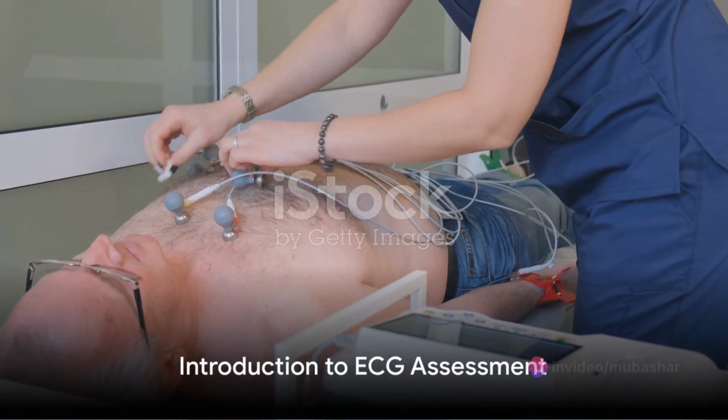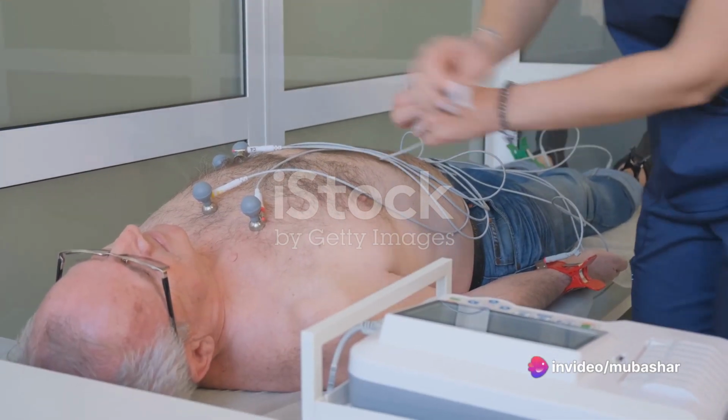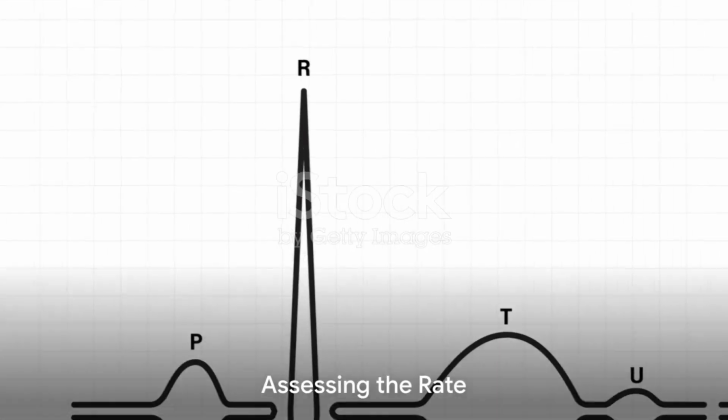Do you know how to assess an ECG for rate, rhythm, axis, intervals, waveforms, and chamber enlargement? Well, if not, this video is about to guide you through the process, breaking it down into simple, easy-to-understand steps. First, we'll examine the rate.